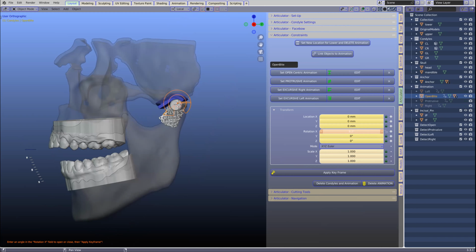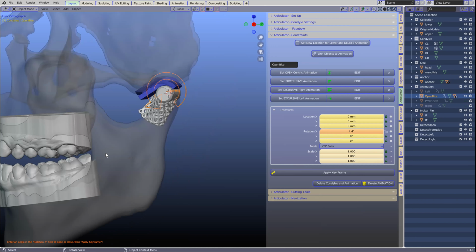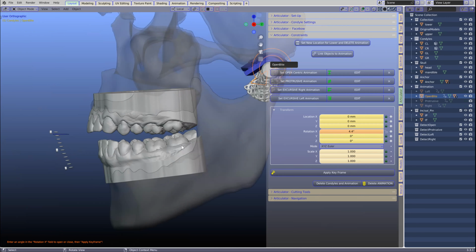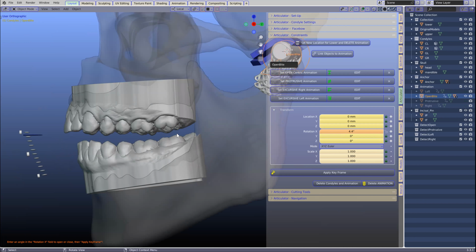As I'm moving here, we can see the front section, for example, has moved 2, 4, 6, 8, 9, nine and a half, I guess, millimeters. The molar. So you're talking about the molar. Is there any way to just have the mandible go just like this, like boop, 3 mils?